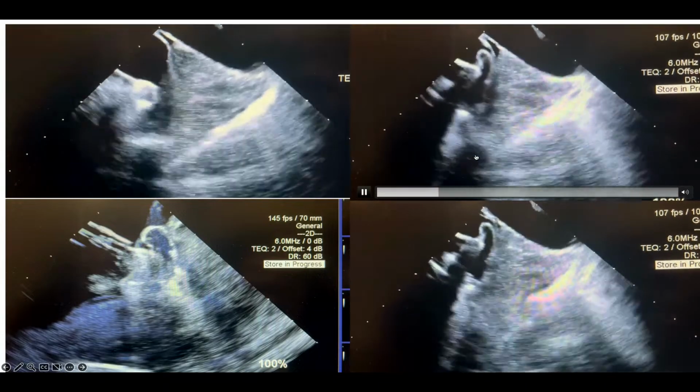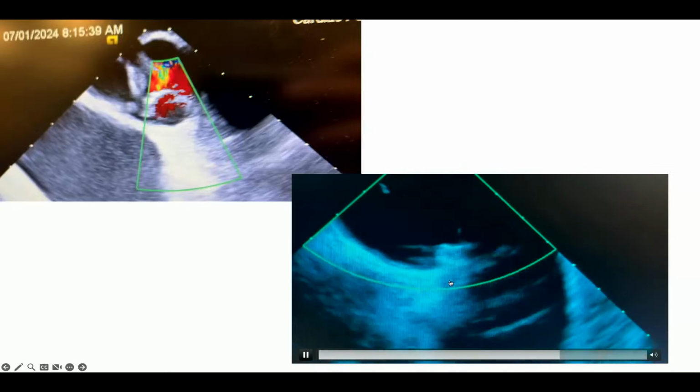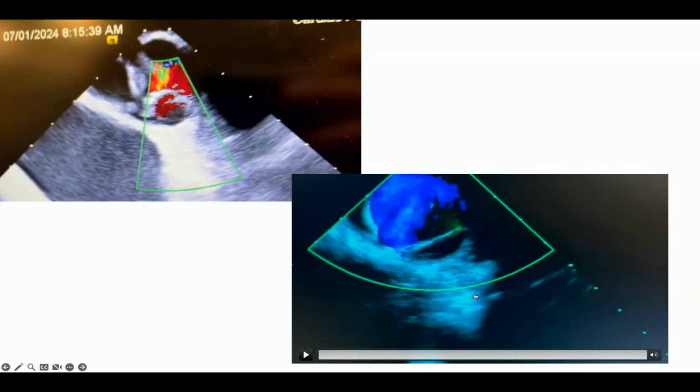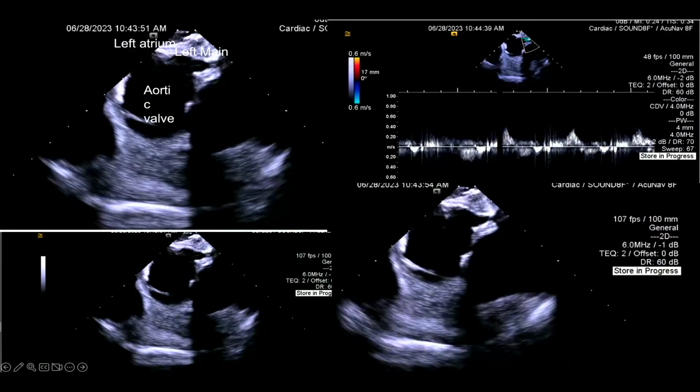And I'm gonna wrap it up because we're almost out of time. The last thing we see, we can check also the work of our interventionalists. I'm gonna show you the left main here. They left a stent outside poking, look at that. That's a stent poking out of the left main from our great interventionalist. So here's a patient with CABG. So you can see the left main very well from the left atrium. I just wanna share this with you.